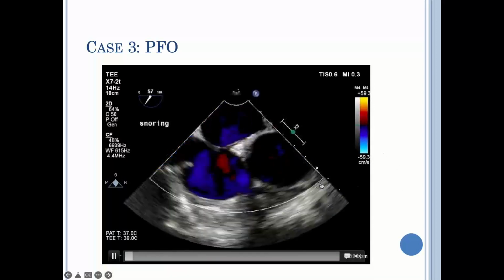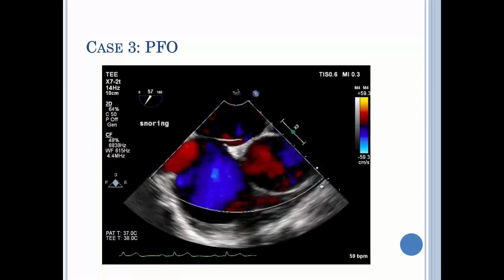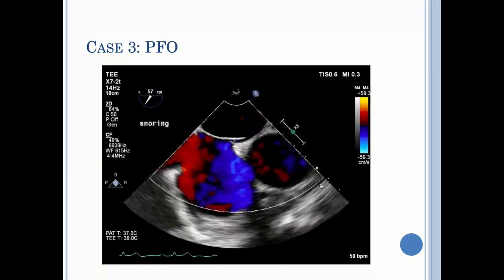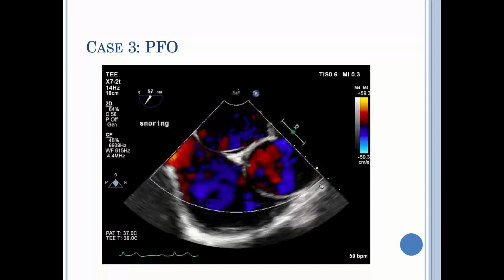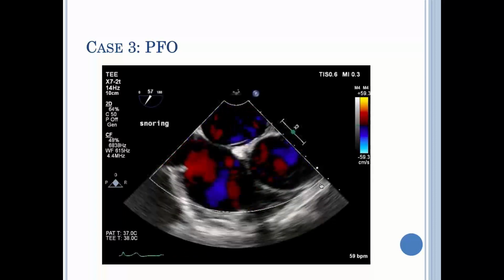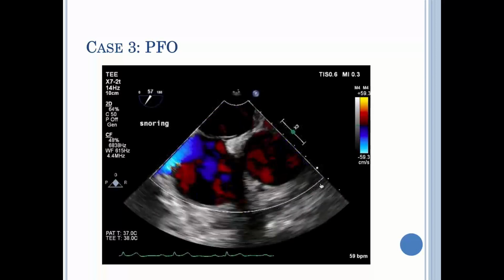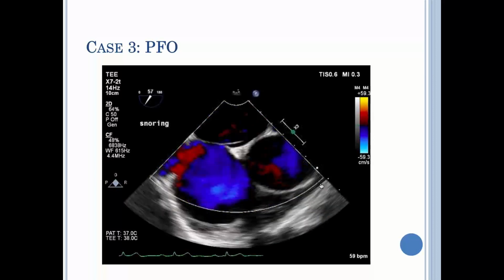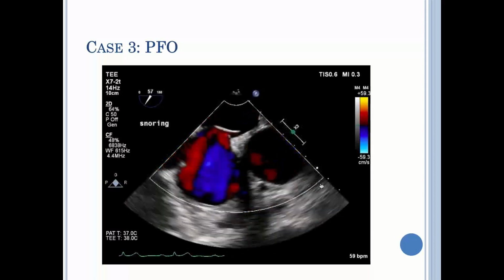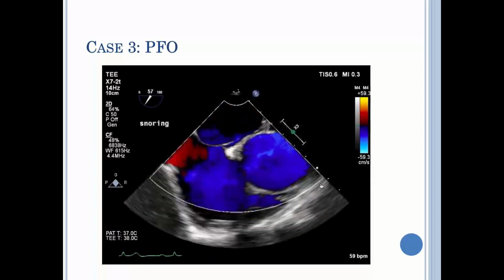Yeah, this is one question I actually asked myself at the end of my cardiology training, and I sort of learned that as I began as an echo fellow. From a transthoracic point of view, anything smaller than 5 millimeters that is discovered by color Doppler, you can't tell. It can be a PFO, it can be a small atrial septal defect. That's usually what we say. Anything where the color jet width is more than 5 millimeters tends not to be PFO unless it's really eccentric. But anything more than 5 on transthoracic tends to be more likely an atrial septal defect. So that's one. On the TEE it is much more obvious.